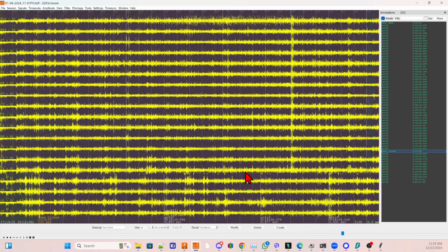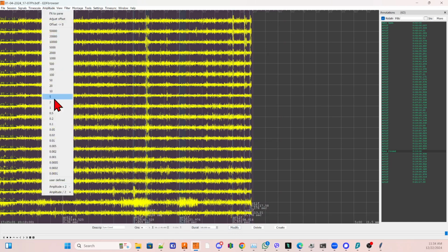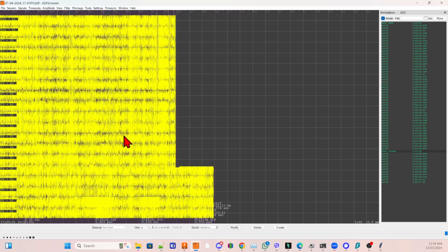Again, take the eyes closed period, and that's sticking out by how much. What happens if we do this? Okay, now we're almost there in terms of correct time span.